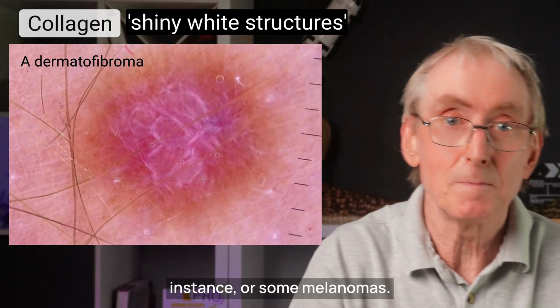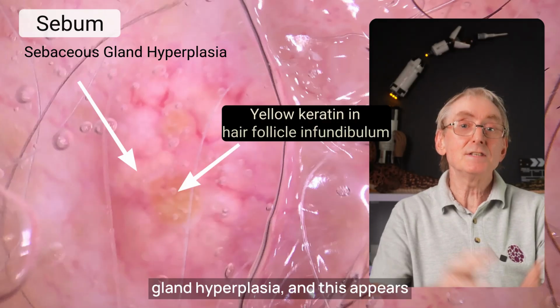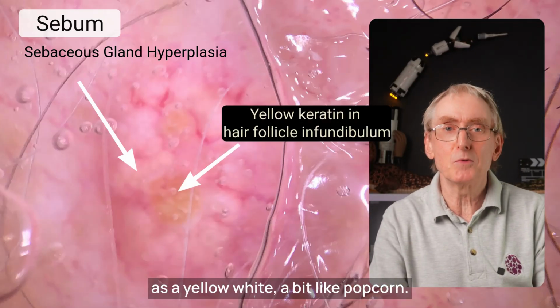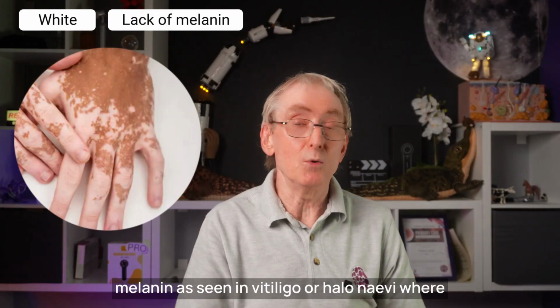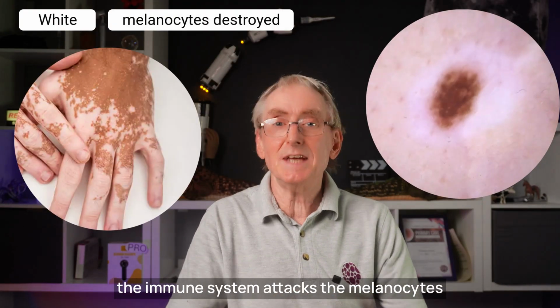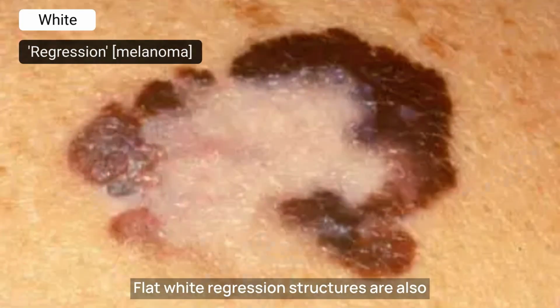or some melanomas. Sebum is often seen in sebaceous gland hyperplasia, and this appears as a yellow-white, a bit like popcorn. White can also indicate a complete lack of melanin, as seen in vitiligo or halo naevi, where the immune system attacks the melanocytes, destroying melanin production in the skin. Flat white regression structures are also seen in melanomas for the same reason.